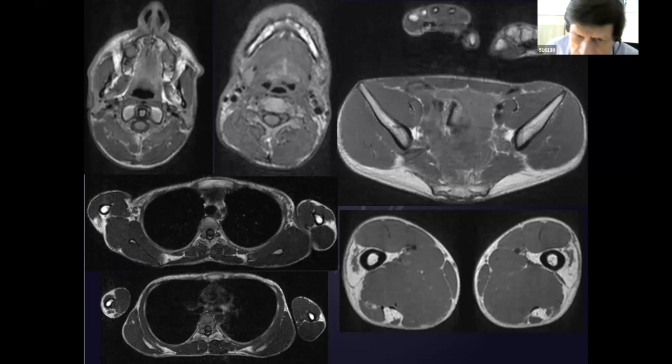You don't have the same spine deformities in all the congenital myopathies and congenital muscular dystrophies. And sometimes the analysis of spine deformities gives you the right diagnosis.